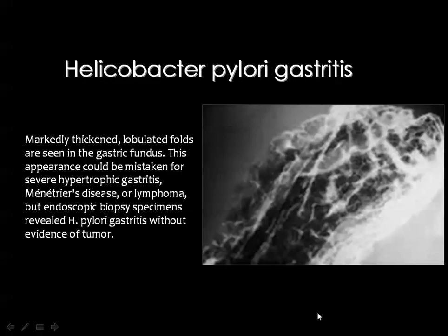And this is a type of H. pylori gastritis, and whenever you see this hypertrophy of the mucosal folds, you may go into a long list of differential diagnoses, which include gastritis, of course, and maybe sometimes some types of gastric neoplasms, especially lymphoma. For this reason, a mucosal biopsy is usually indicated in order to confirm or to disprove the possibility of a malignant lesion.